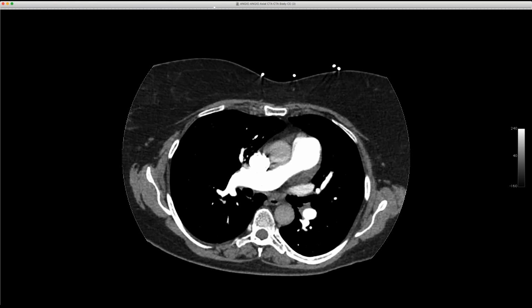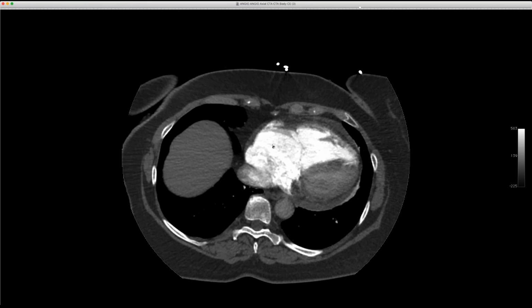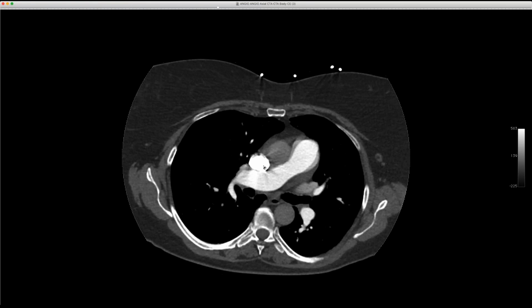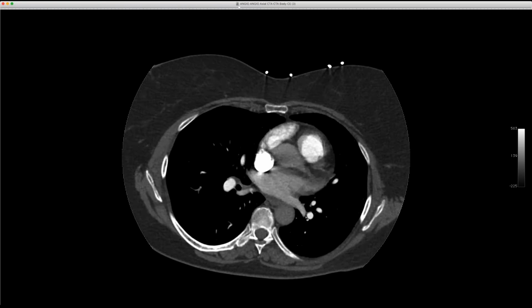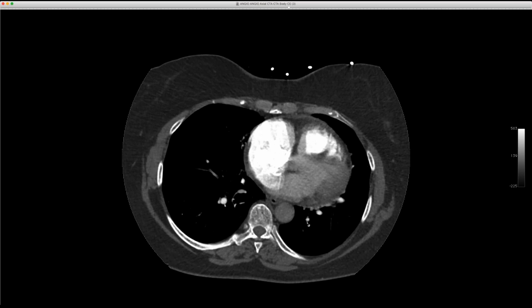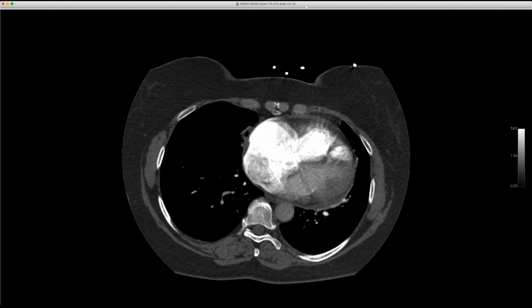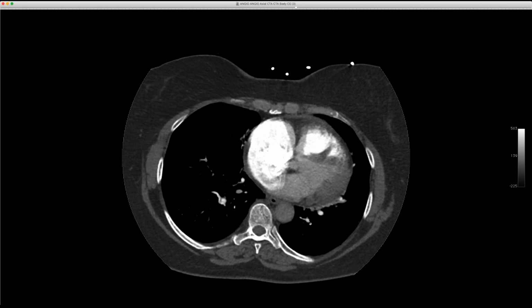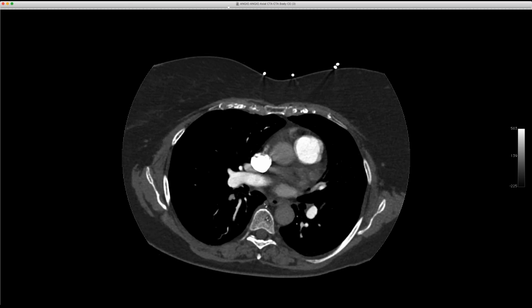CT scan shows right ventricular hypertrophy, enlargement, and this I think is an outside scan. But you can see, as I scroll down, there's a couple little webs and areas of segments that aren't well perfused. Right here, you can see kind of a little small vessel and then a little bitty web here, but not a lot in the way of central thrombus.